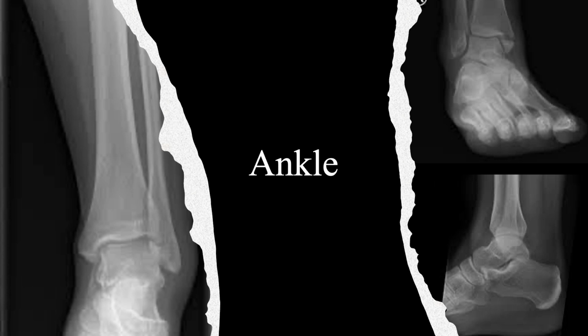However, you can check the fibula for defects, any oblique fracture lines, check the tibial cortex and the articular surface for any fractures or disruptions, check the talus for any fractures. So here, you have the talus. Look to see if there's any fractures there. You want to make sure that you see the joint space between the talus and the navicular. So that's right here. You want to look at the calcaneum, see if there's any fracture lines or cortical disruptions there. Here is this bone. You want to check the entire cortex, look all the way around, see if there's anything there.